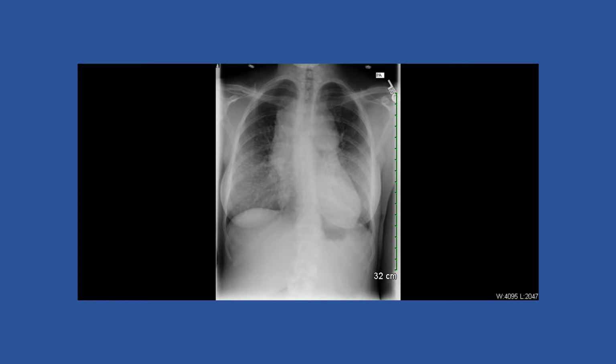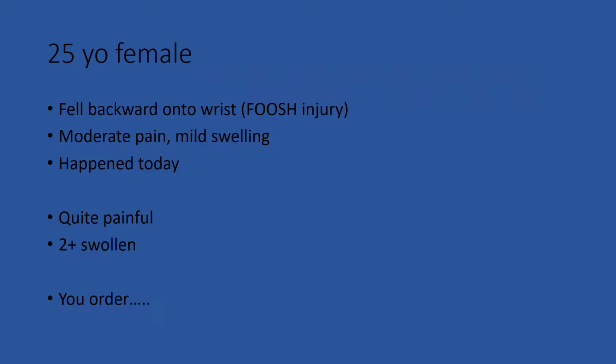When you have an abnormal finding like this, in this case, the radiologist actually called me and talked it over with me. But if you had this abnormal finding, you could also ask the radiologist to look at it. Most of us are in a situation where there's a PACS system, so even if you're in a remote site, the radiologist can take a look at it.